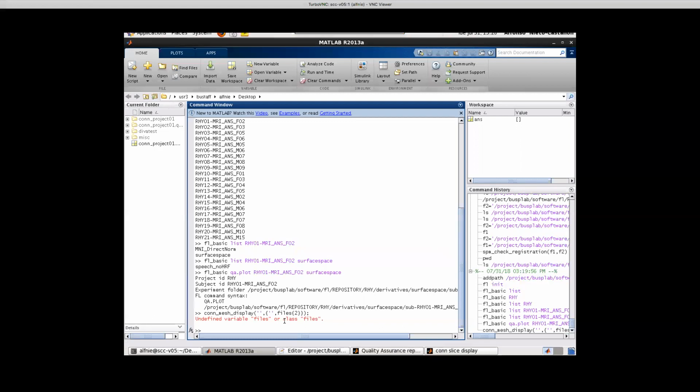From a QA standpoint, I don't feel quite as strongly as from an interpretation standpoint. So I guess this falls under QA, but you want to see what the individual's speech minus baseline contrast looks like on that individual's surface anatomy.